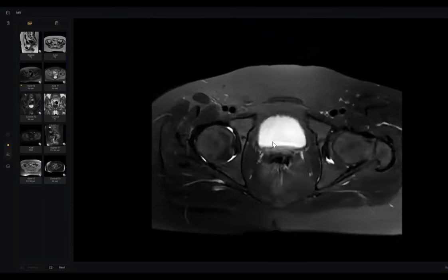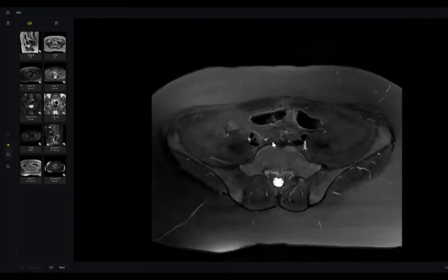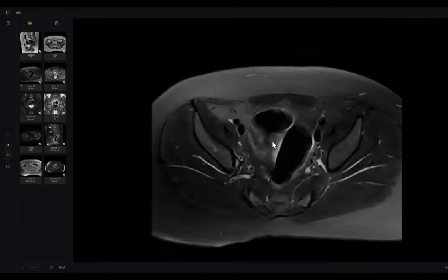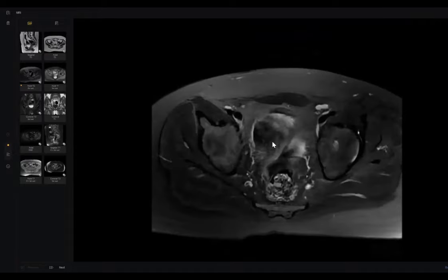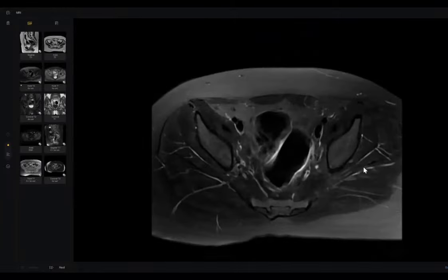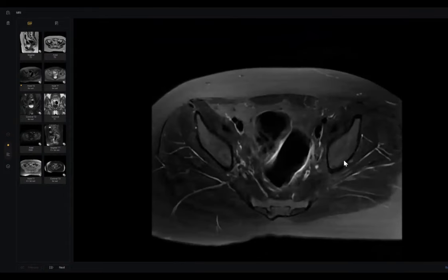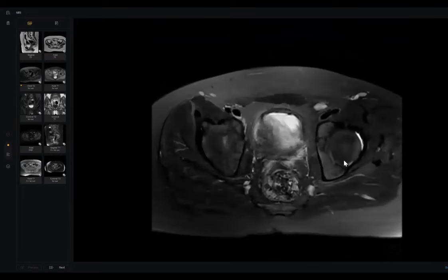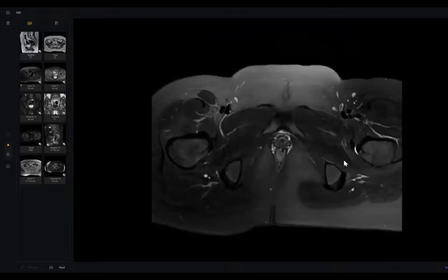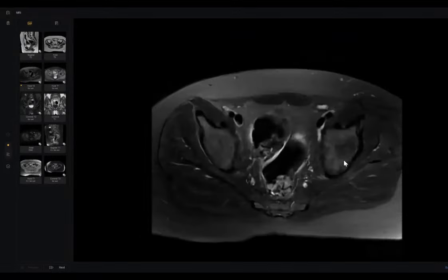Really, I couldn't appreciate any. Which sequence are you 100% sure about the presence or absence of testes?